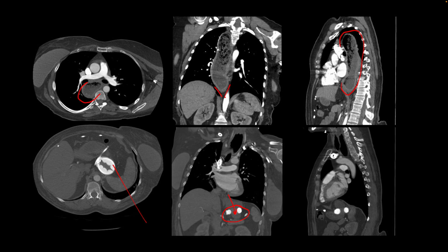And so it seems the patient got this gastric lap band placed, and it was recently tightened at another facility before they came to Houston to take a vacation, and it was too tight and it wouldn't let anything go past, and that's why we see this finding of distended and dilated esophagus. They presented with nausea, vomiting, and chest pain. And so the lap band is connected to this tubing, which goes to a port in the subcutaneous location, and the port is punctured, and saline was removed to make this less tight, and her symptoms were relieved.